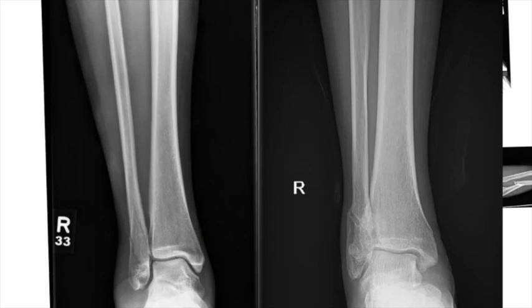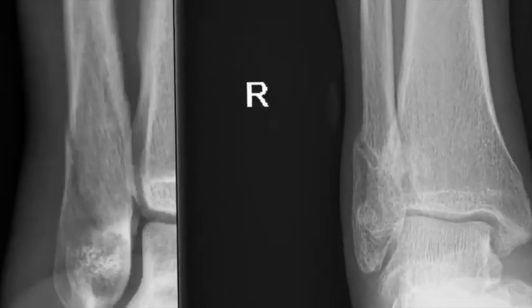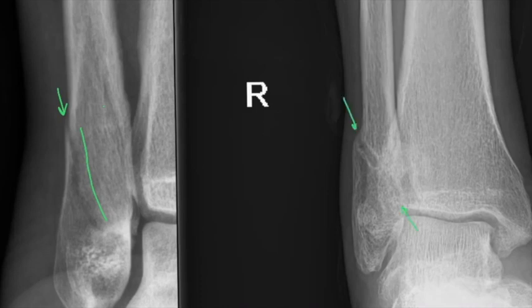There's also an abnormality in this other ankle, and we're going to compare the appearance of these fracture lines on the two x-rays. And you'll see that while here you have this bit of a jagged edge and you have this lucency, on this side you also have a lucency, but you have this sclerotic or bright appearance along the path of the fracture line.